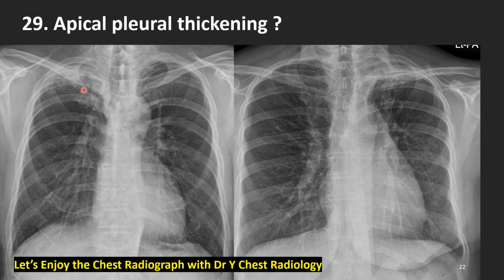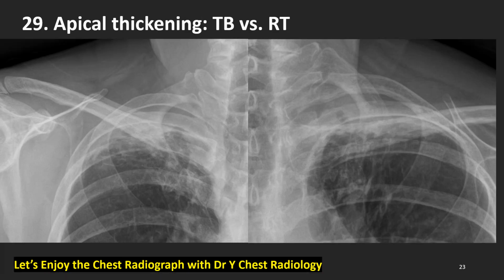What are the causes of these two different cases with the same radiologic findings? This is also the magnified view. Right side is from tuberculosis, sequelae of chronic tuberculosis of the right upper lobe. He is now okay because it is stable. How about the left apex of this woman?